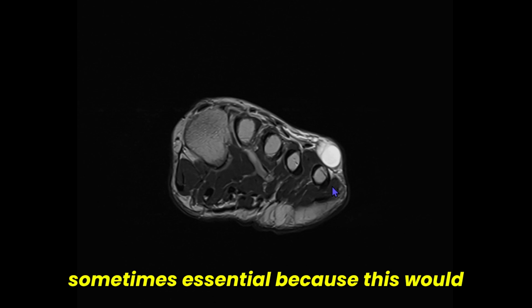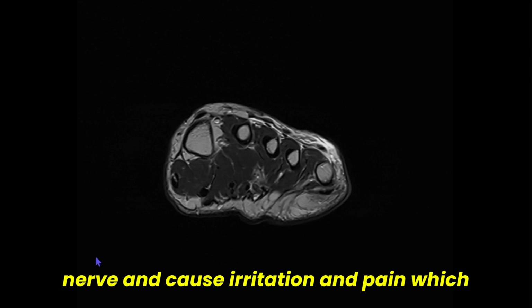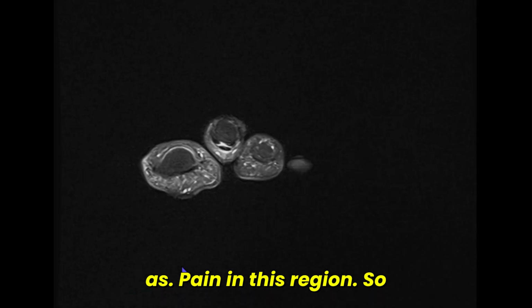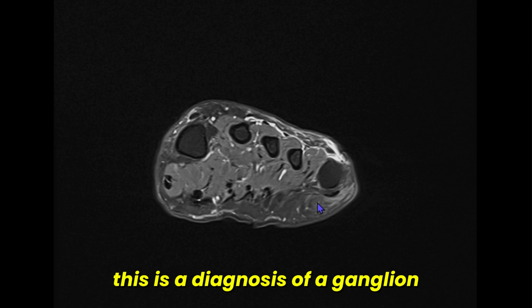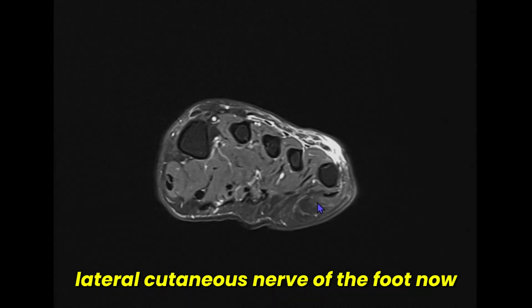This is sometimes essential, because this would lead to compression of this nerve and cause irritation, which would lead to paresthesia as well as pain in this region. So this is a diagnosis of a ganglion cyst along the course of the dorsal lateral cutaneous nerve of the foot.